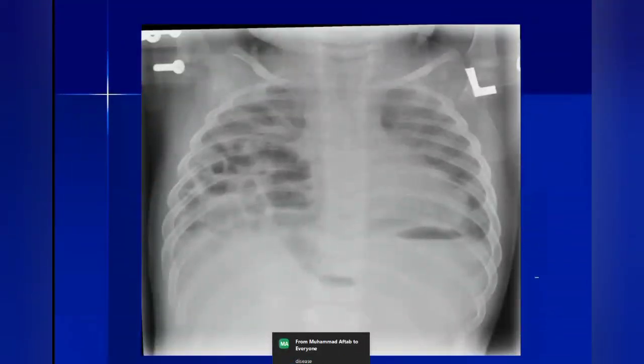A newborn who developed respiratory distress. Sir, this is the frontal projection of a skeletally immature patient, a newborn, as you have told me. I can see cystic lucencies occupying the right lung. However, the lung volume appears somewhat increased because of these cystic lucencies. The left lung appears normal to me. I can appreciate the diaphragm on the right side.